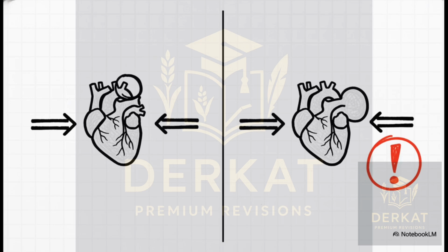C also includes looking at the mediastinum. That's the central part of the chest containing the heart and great vessels. Does it look unusually wide? This is a really critical finding that could point to something as serious as an aortic dissection. Also, you want to find the aortic knuckle. That's the shadow where the aorta arches over. Is it unusually prominent? Because that could be a sign of long-standing hypertension or even an aneurysm.